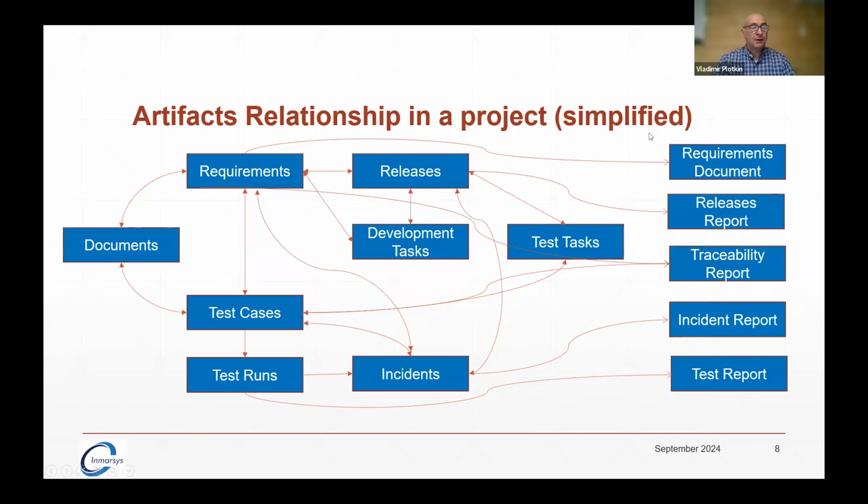Then you can create reports, and reporting is a really big thing in Spira, pretty much in the entire project. You can generate your requirements report, and your release report, so your complete history of what was released and how. You can generate your traceability report, which is required by the standard, like a bug report, something FDA would definitely want to see, and a test report. That goes into your formal test reports.